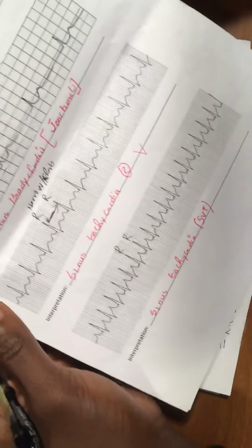Let's see again. Let me show you another example. Those are very important things that I'm showing you right now. This will be helping you in the future. Let me show you these things. I found another one that's really important.